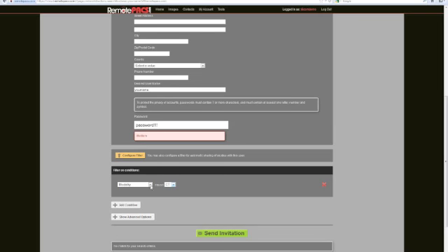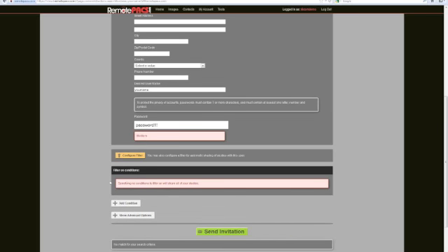We just allow this user to view our CT. And the next one is referring physician. So we can select Smith or whatever. And if the study comes in with a referring physician listed as Smith, this user will be able to view it. Finally, if you select nothing, it will specify that they'll be able to view everything that's in your account.